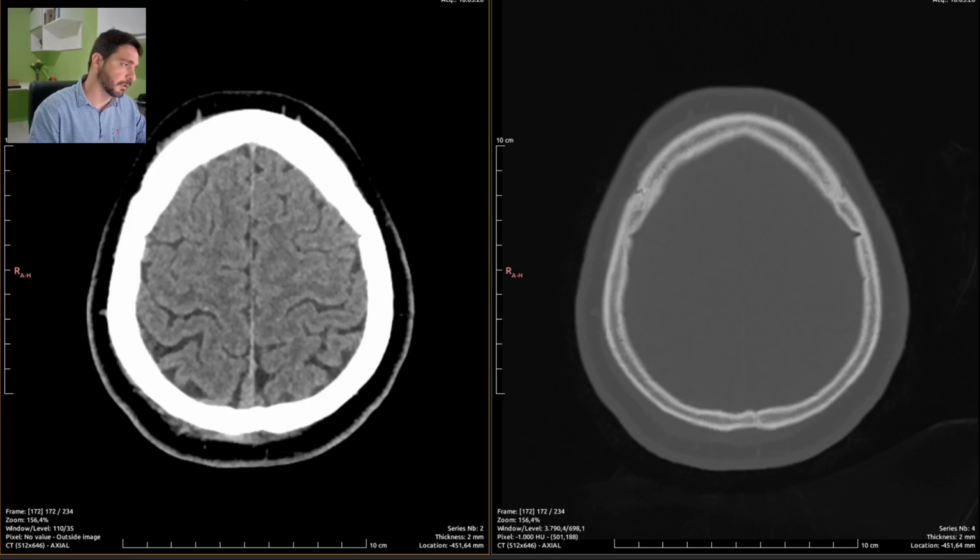Let's just grab a template. Of course, I have a template for a normal CT scan of the head. I'm just going to copy and paste it. I'm just going to sip my coffee because coffee is the best. Yeah, that's awesome. So, encephalon. No injury to the brain.